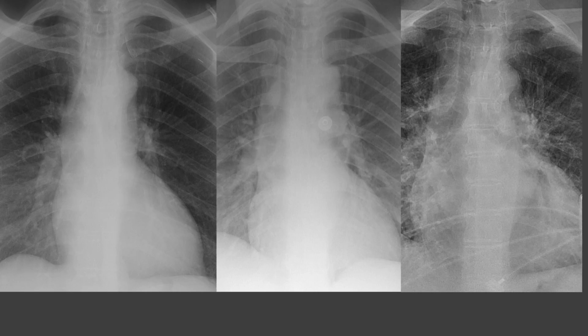Okay, so here's a person that's going into congestive heart failure. And so on his first chest radiograph, what do we notice? We can see that the vascular pedicle width is actually normal in size. So here's the outer edge of the SVC coming down through the central airways here. And so we can see that it's normal in caliber.